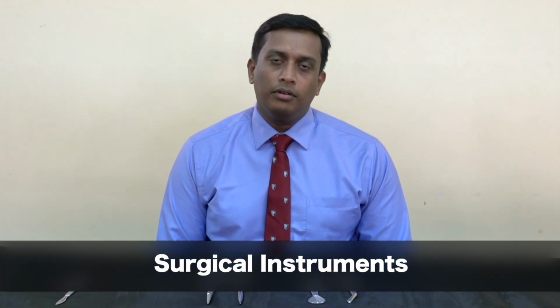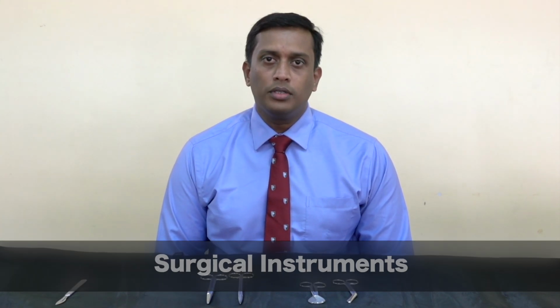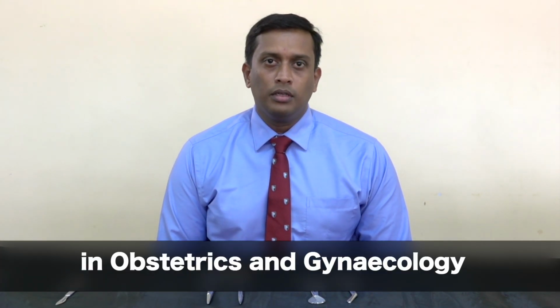In this video, we are going to demonstrate basic surgical instruments used in obstetrics and gynecology. Obstetricians and gynecologists use different types of surgical instruments depending on availability, experience, and surgical need. However, undergraduate students need to know about basic surgical instruments, their function, and their uses.